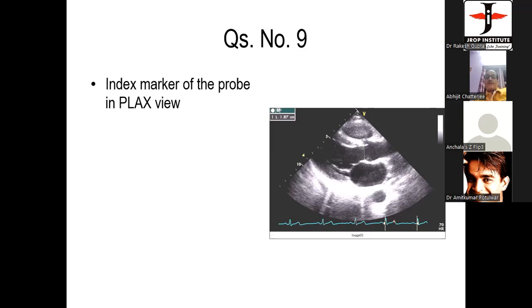If you look at the left of the picture, that is the annulus and the LVOT, those are measured from trailing edge to leading edge in systole. If you look to the right of the picture, the three structures, the sinuses of Valsalva, sinotubular junction, and the proximal aortic diameter, these are measured in diastole from leading edge to leading edge.